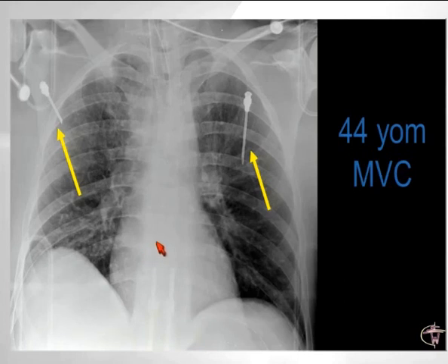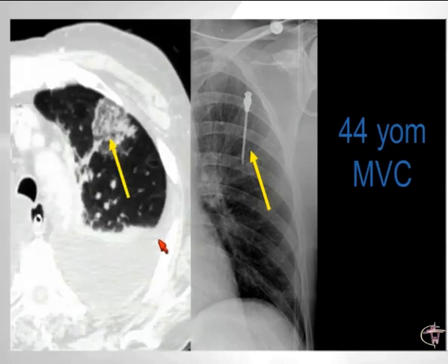If the pneumothorax is large and if the pneumothorax is decompressed, then these things work very well. But if the diagnostic accuracy is less precise, these things can cause pulmonary lacerations and contusions, like in this case of a different patient.